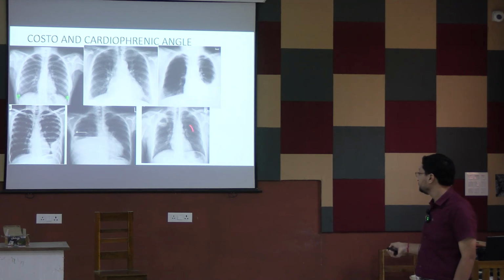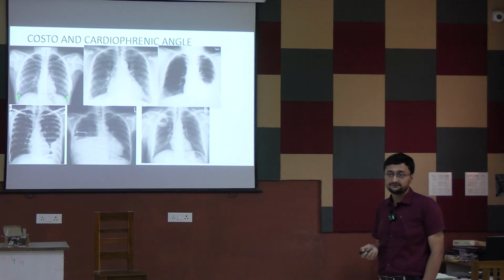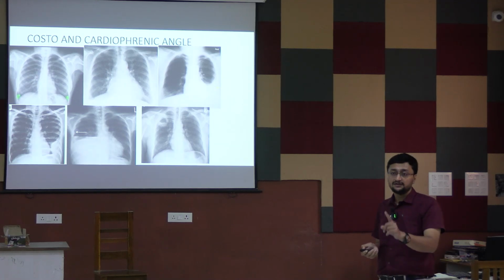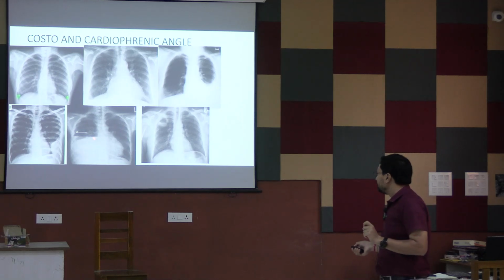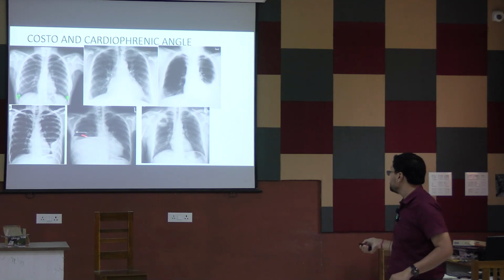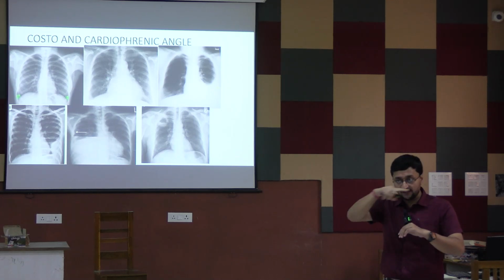Just like that. Why is this an abscess and why is this hydropneumothorax? One, very good. This is a thick wall. The air fluid level inside the thick wall cavity is there, and most importantly, the horizontal air fluid level in the previous X-ray is just parallel to the diaphragm. That means through and through, just parallel to the diaphragm.